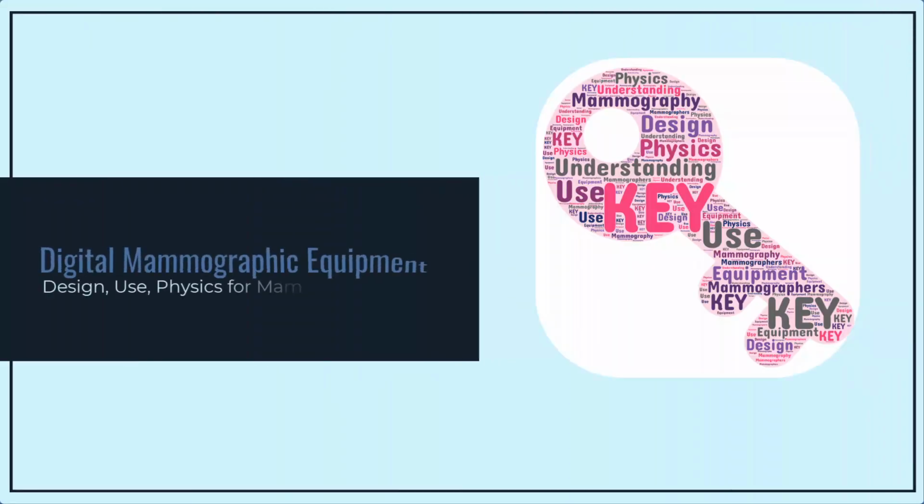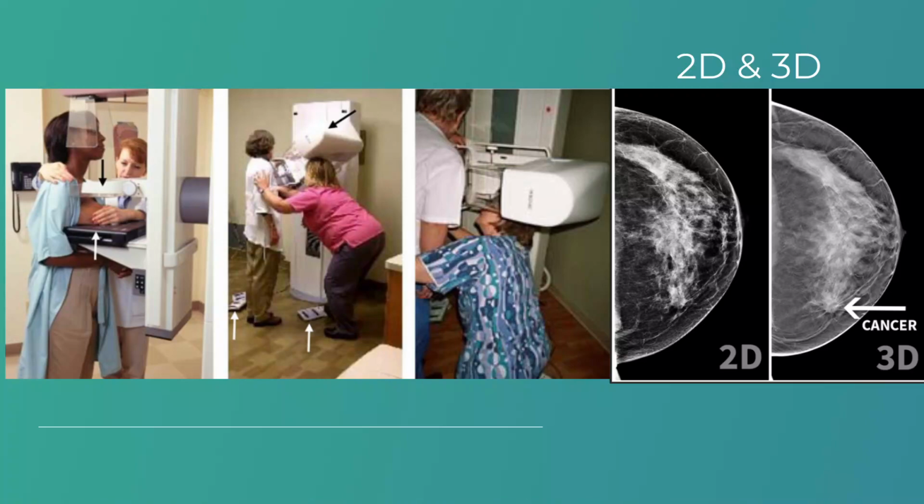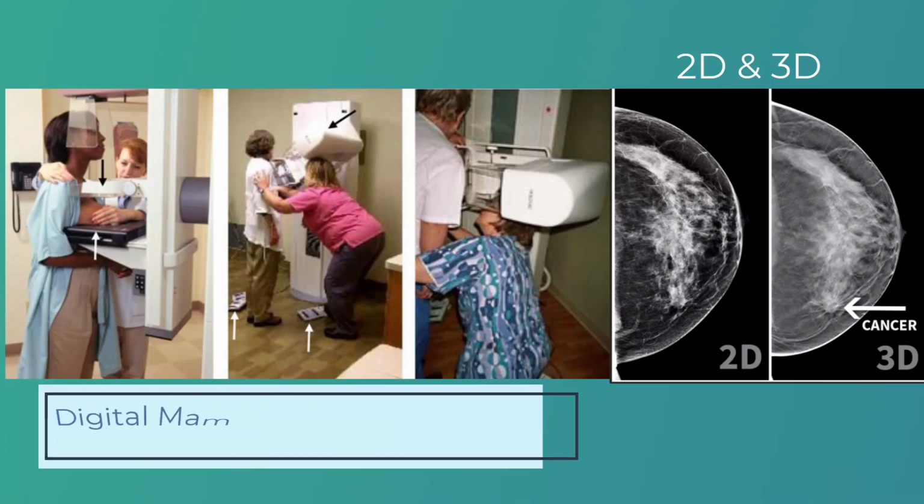Digital mammography equipment, design, use, and physics for mammographers. Let's take a look at how to optimize our equipment to produce quality 2D and 3D digital mammograms.